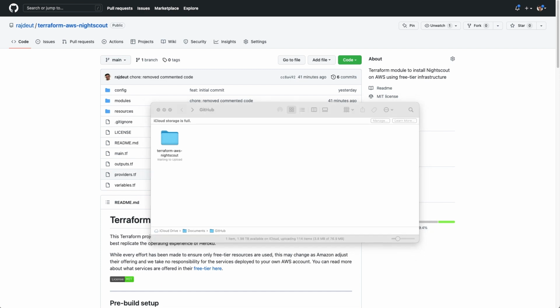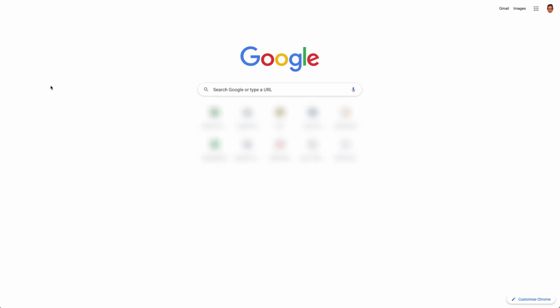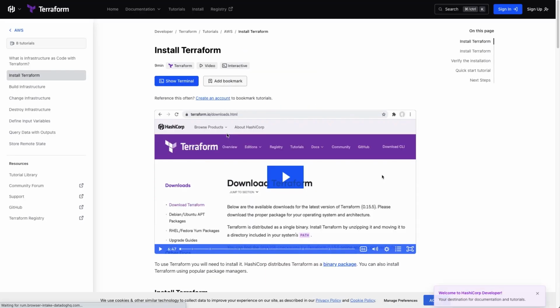And the next step, we're going to install Terraform. So Terraform is essentially an application which takes code and processes it and connects to a cloud service like AWS, or it could be something like Google Cloud or Heroku or Azure if you're into Microsoft's cloud, and spins up or creates all of the services and links everything it needs to according to the code that you've written.